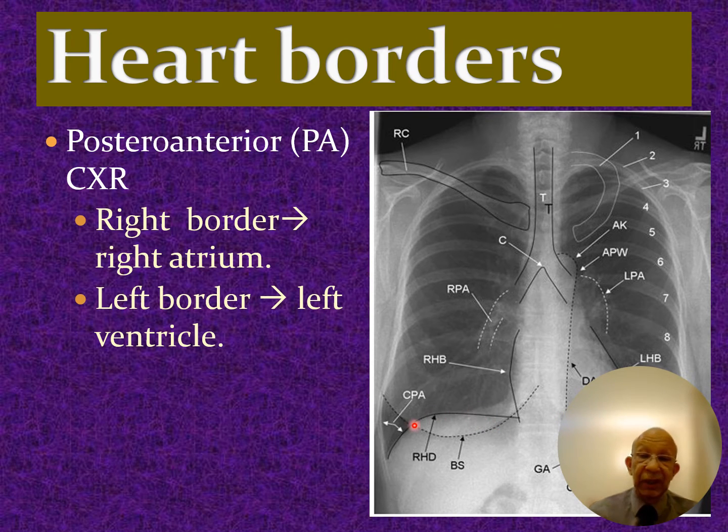Now, you can see the right hemidiaphragm. You can actually go through it from end to end. It's very clear. This is called the silhouette sign, and it's the interface between the air-filled or gas-filled lungs and the solid organs. And this line is also a silhouette sign. It's crisp and clear. You can trace it from top to bottom. Now, this is the costophrenic angle, and the rule for that is that it should be sharp and deep.